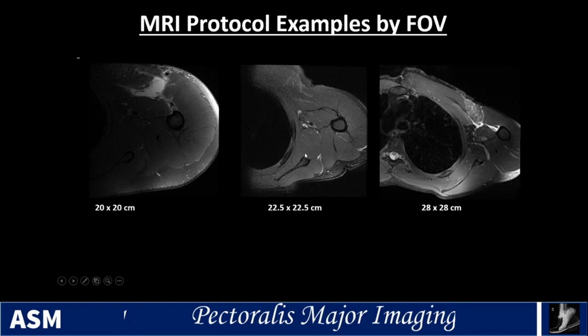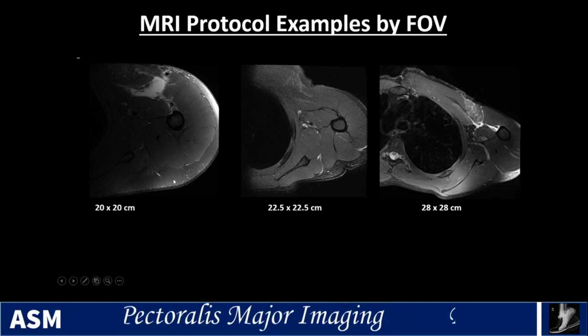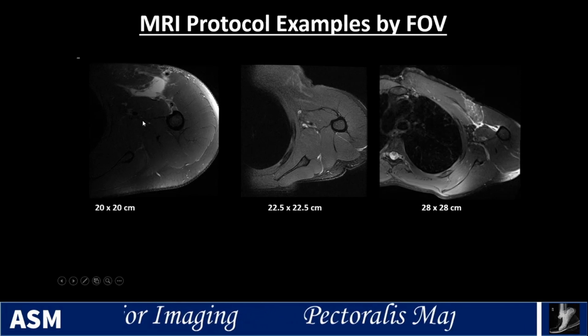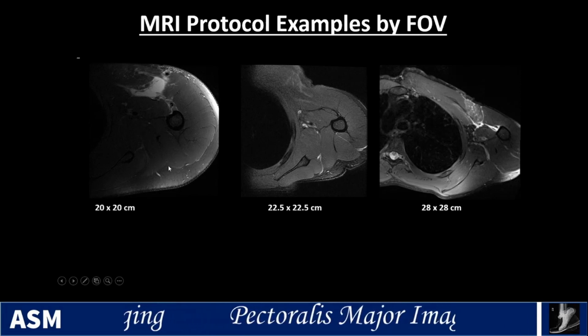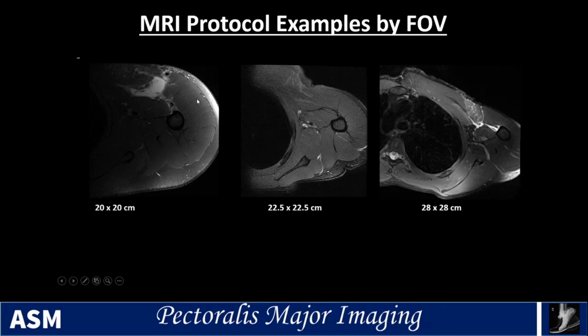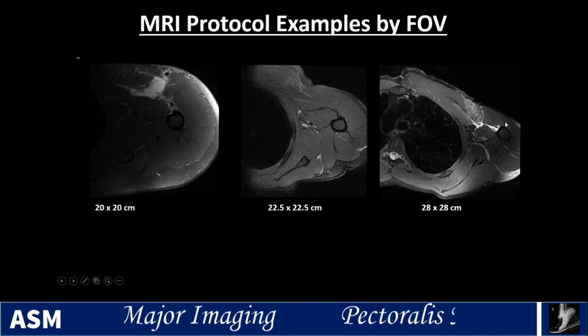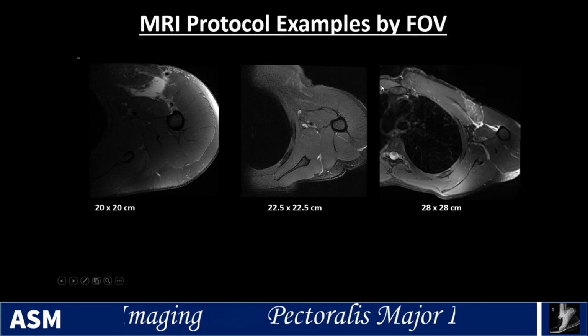But if you look carefully at the images here, you'll note that you get a little bit more spatial resolution and more detail when you look at smaller field of view images here. So you're seeing more of the anatomy of these muscles when you compare to a larger field of view where it just sort of blurs a little bit. So you want to look at your patient.